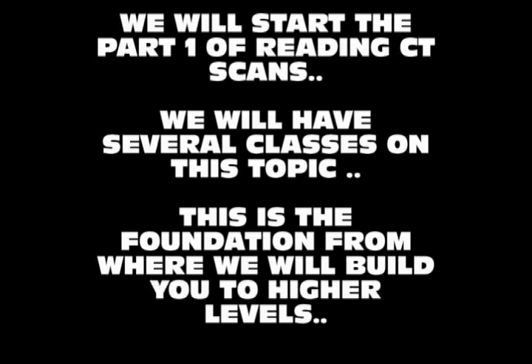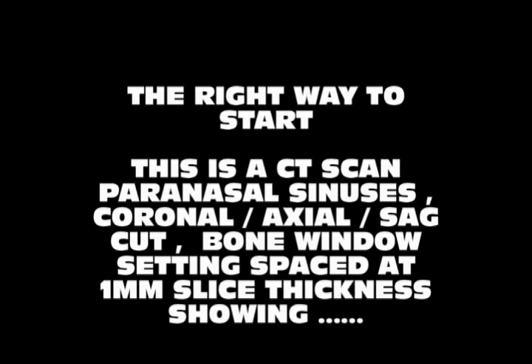We will start part 1 of reading CT scans. We will have several classes on this topic, and this is the foundation on which you're going to build up. The right way to start, as a PG, is to just say this is a CT scan paranasal sinuses, coronal, axial, sagittal cut, bone window setting, spaced at 1 mm slice thickness or 2 mm, etc.